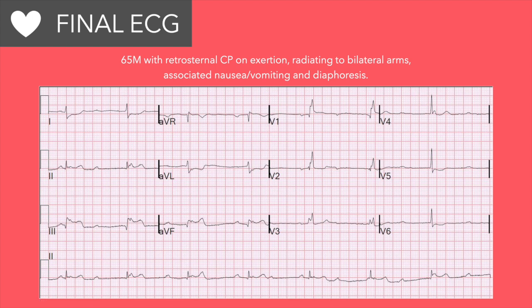In terms of intervals, the PR intervals vary, which is consistent with a 3rd-degree heart block. PR gets longer for Wenckebach, PR stays constant for Mobitz type 2, and PR varies for 3rd-degree heart blocks. The QRS looks wide here. And why is that? Oh, because I see bunny ears. Boom, boom, boom, boom, bunny ears in this right bundle branch block pattern.